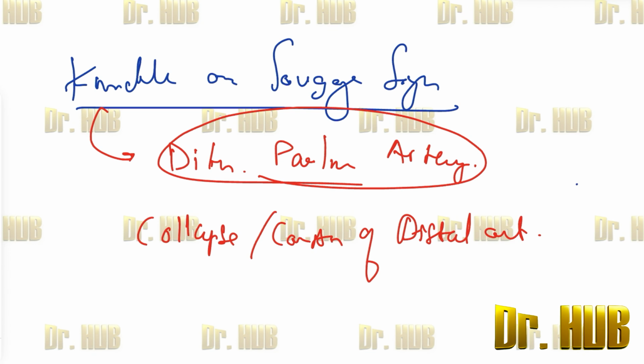So there is abrupt tapering of arteries.